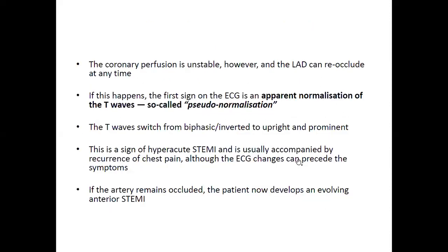If you see that pattern, it is characteristic of what is called pseudo-normalization, and that means that there is a reocclusion of the LAD coronary artery. So this is a sign of hyperacute STEMI and is usually accompanied by recurrence of chest pain, although the ECG change can precede the symptoms. If the artery remains occluded, the patient can later develop STEMI, classical ST elevation MI.